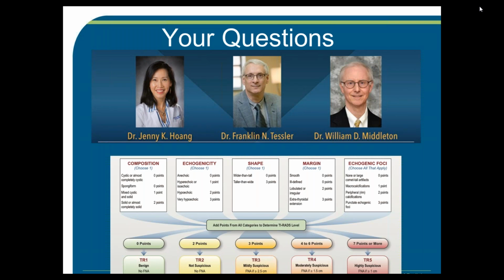The most important thing there is to document size changes and to document the presence or absence of any suspicious cervical lymph nodes. In both of those cases, the patient would probably end up going to surgery. This case is really similar to the active surveillance programs in Japan. If there's a change in size or if there are new nodal metastases, that would be a point where you draw attention to it and say that it's progressed, and those patients would more likely get surgery. Also, any invasion outside the capsule, if that's been a change, is really important.